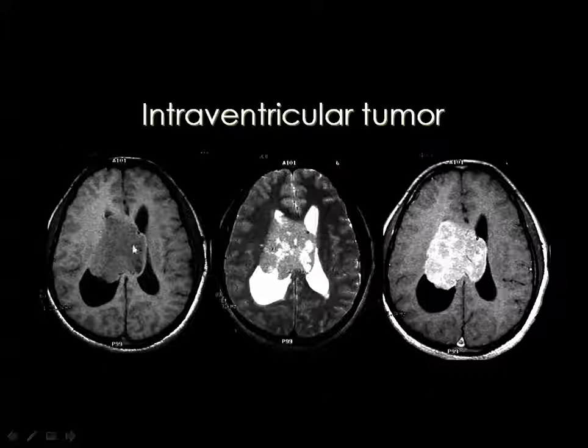Then if you see a case like this, this is axial T1 weighted image, axial T2, and axial T1 post contrast. And you can easily diagnose that this is an intraventricular mass or an intraventricular tumor. And because of the absence of significant cystic changes, and this is an adult patient, then you may say that this is an intraventricular tumor, which may have the possibility of a choroid plexus papilloma or an ependymoma.